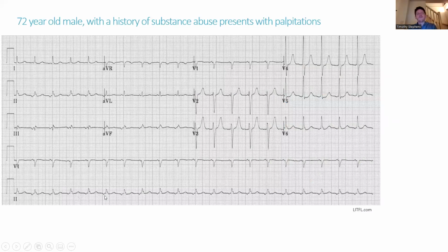So can anybody maybe put in the chat what they think this is? Let's have a go. I'll be impressed, actually. There's a hint where it might be coming from. Yeah, so somebody's put a junctional rhythm. I couldn't be blamed for thinking that. I guess my thing is at the moment, we can all agree that this is not sinus though, isn't it? It's not sinus. Where do we think it's coming from?